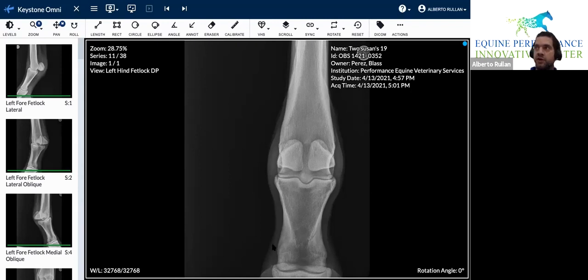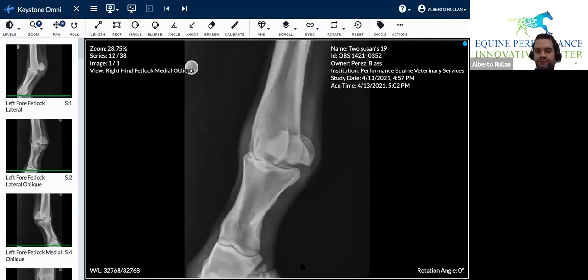Then same thing, P1 going down, P1 going down, boom, up. And in the pattern of lucencies, which is one of the papers you will read, sometimes you're going to have a normal lucency, just the way the anatomy of the bone is. Lucencies here are no good, very difficult to deal with. Lucencies here are more acceptable.